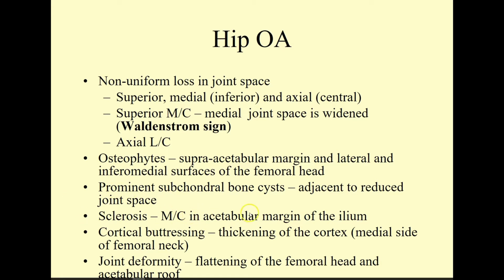Sclerosis, particularly on the acetabular side, we'll see these discrepancies in subchondral sclerosis, or sclerosis immediately adjacent to the articular surface, and that really has to do with the difference in mechanical strength. The femur is so long, its cortex has to be thicker for it to function as an effective lever. The acetabulum mostly is just going to bear down on top of the femur head, so when there are degenerative conditions, we find the acetabulum has to change more quickly than the femur head does. We'll see that in other areas.